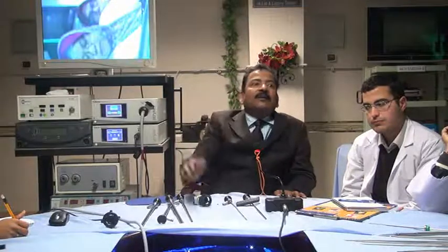But it is not like only HD will fit here. Any telescope you can attach. If you have a very good camera but your telescope is not good, it won't give you a good image. So it should be good quality. Because the main function of the telescope is bringing the image up to the CCD, up to the camera head. During bringing the image itself, it creates a lot of resolution loss. And how can you expect to have a good vision? So whatever is written, that will be there.